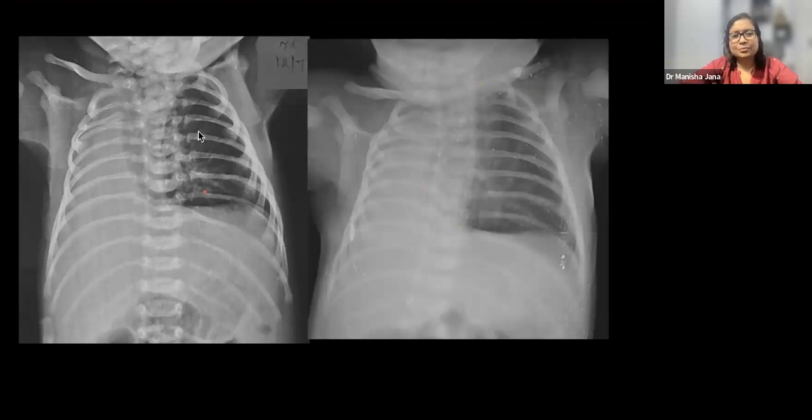This is the radiograph of a 2-year-old kid. What we see is a small volume right-sided hemithorax. It seems that there is no lung at all on this side, and that's why the mediastinum has been shifted to the right side. The heart is also not visible because of the extreme mediastinal shift. Now, if this is the picture from the beginning, since birth, then pulmonary agenesis becomes the possibility. If the same appearance is seen in an older child, we would be thinking about a foreign body.